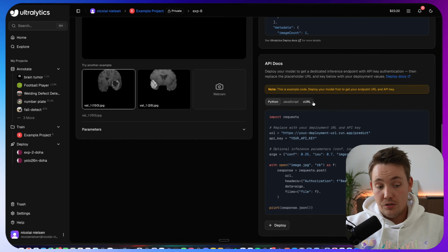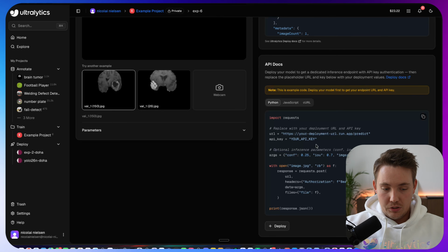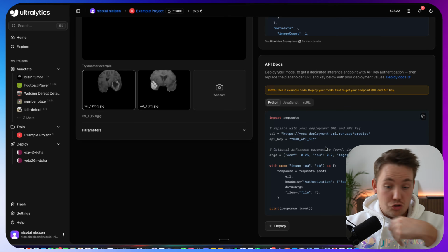We have a video previously where we go through the full pipeline, how you can use this in your own code, both exporting the model, exporting into an optimized framework, how we can send these requests to the trained models as well.